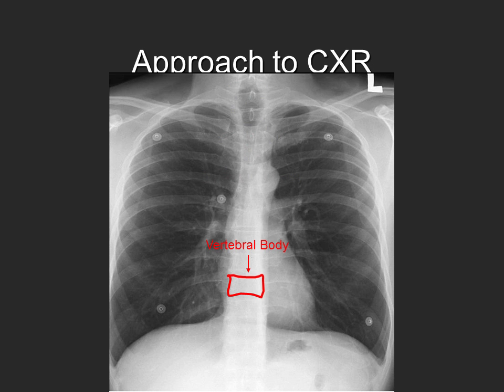Next, assess the film's exposure. If the thoracic spine cannot be seen behind the heart, then the film is too white and thus underexposed. Finally, assess the degree of inspiration. A deep inspiration is required to obtain a good image of the lungs. When the 6th anterior ribs or 10th posterior ribs are visible, the study is considered to be taken with an adequate degree of inspiration.